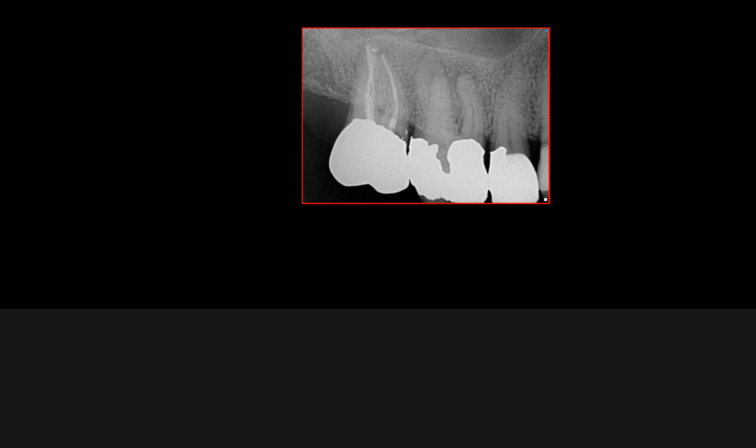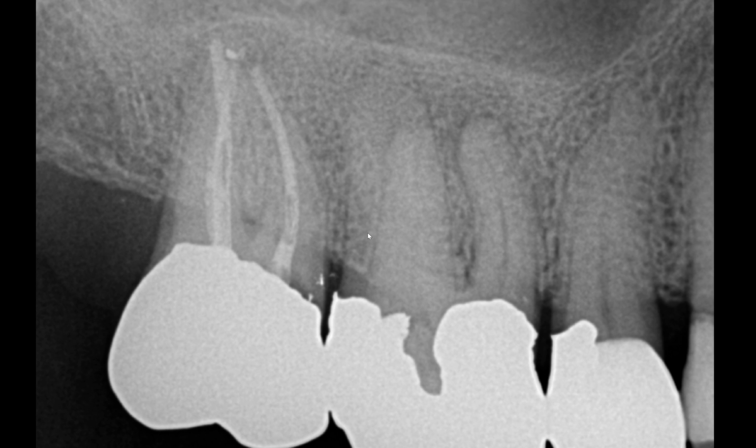So I'm going to take you through this case. This periapical radiograph was referred to our clinic from outside, March of last year, 2019. So take a moment to evaluate this PA. Pay specific attention to tooth number 3 and its surrounding bony structures.